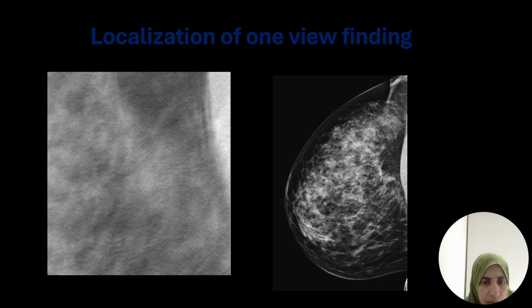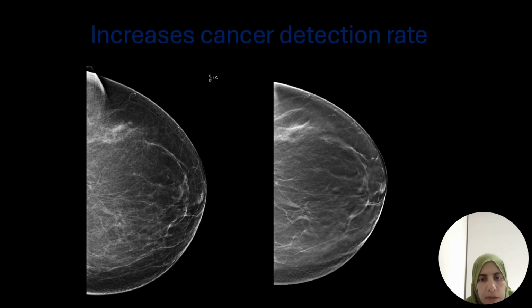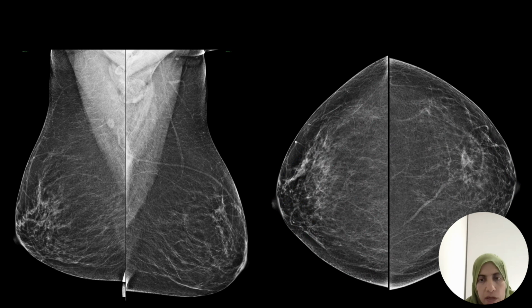You see it's coming now, and you see the distortion associated and the spiculations. Okay, another lesion, you barely see the lesion here, and you would see on the tomosynthesis, and I'm sure that it will be very obvious for you to see it, which is here. Another one, you barely see the distortion, and in the spot, you could see that there is a distortion here.